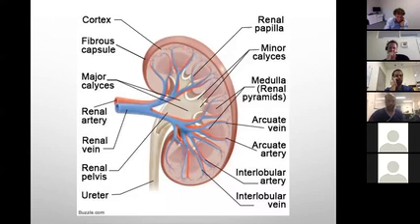All right, so just a quick brush through on some anatomy of the kidney. I'm sure you all know about this. Just a few points that I want to highlight when you're doing ultrasound is, obviously, that's your long axis. Can you see my cursor running around? Okay, good. That's a long axis of the kidney. That's what we're trying to capture in the center of the kidney. So you should see the collecting system coming in, or the renal vessels coming in when you're measuring the length of the kidney. You can't be lateralized. You need to be in the center of the kidney to measure the length.